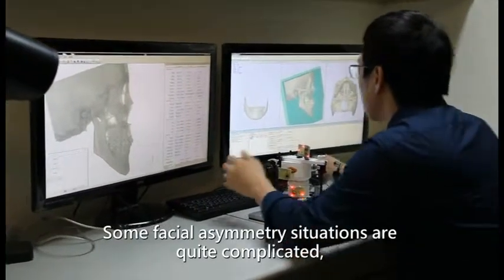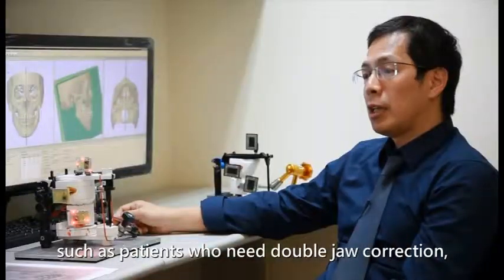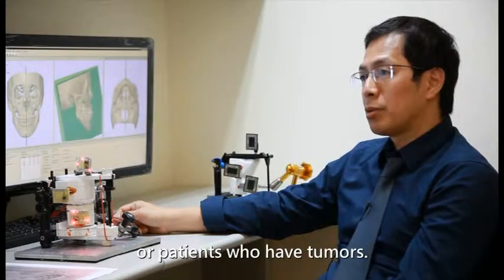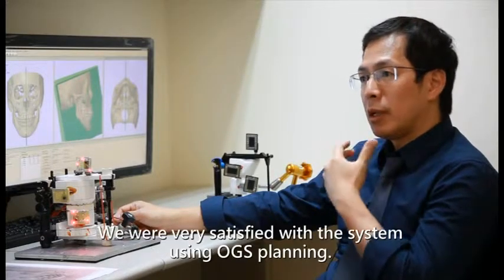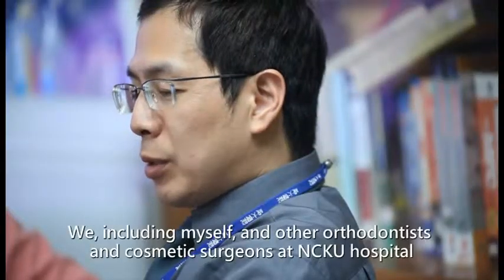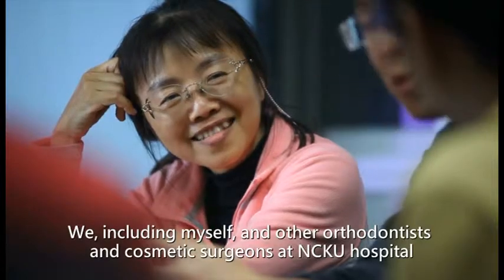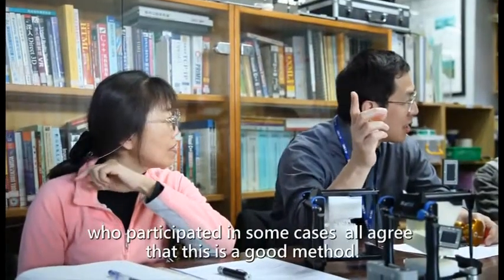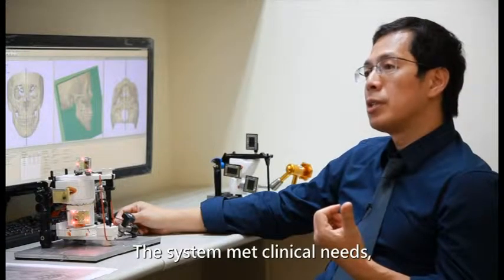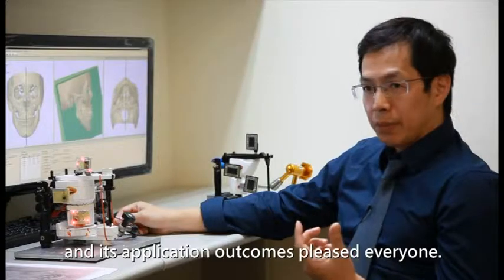Some facial asymmetry situations are quite complicated, such as patients who need double jaw correction, or patients who have severe asymmetry, or patients who have tumors. We were very satisfied with the system using OGS planning. We, including myself and other orthodontists and cosmetic surgeons at NCKU Hospital who participated in some cases, all agree that this is a good method. The system met clinical needs and its application outcomes pleased everyone.